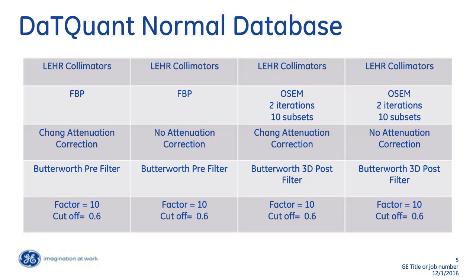And we appreciate that the GE normal databases don't necessarily fit local needs. So it may be appropriate for you to build your own user-defined normal database. And this can be done in DaTQuant, so I'll go on to show you that now.